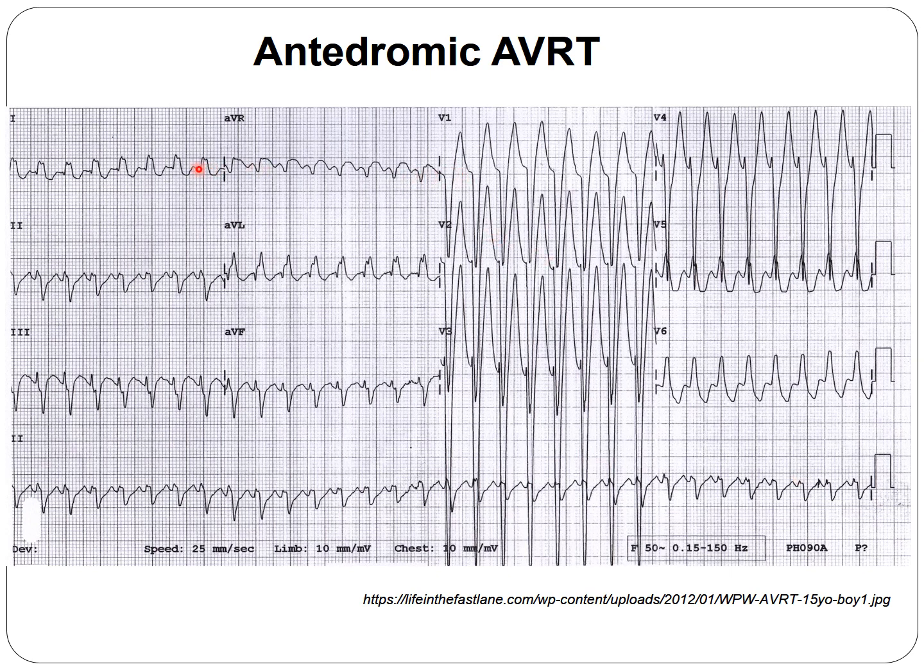Looking at this graph, you can see immediately that it is a tachycardia with very wide QRS complexes. It looks like a ventricular tachycardia, but because we know that the patient has this bundle of Kent, we know that it is a supraventricular tachycardia. To differentiate between a ventricular tachycardia and an antidromic AVRT, we can apply carotid massage. Carotid massage works only in antidromic AVRT, while it is completely ineffective in ventricular tachycardias.